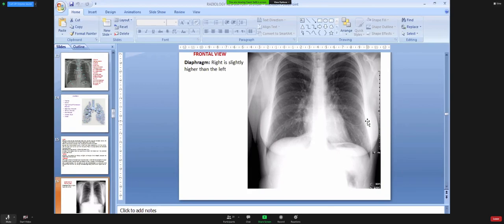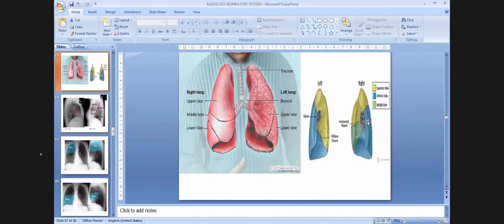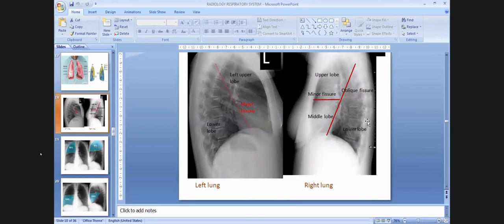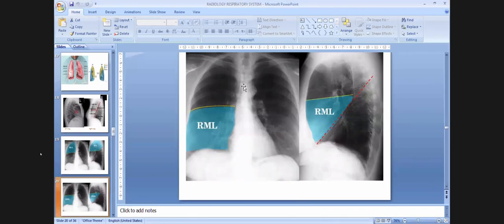Doctor, the right main bronchus is clear but the left main bronchus is not clear in the points. If I am going to ask you, I will choose a very obvious image. This one, for example, the right and left main bronchus are very clear. Don't worry. If I ask you about the right main and left main bronchus and trachea, I will choose a good quality X-ray. Okay.